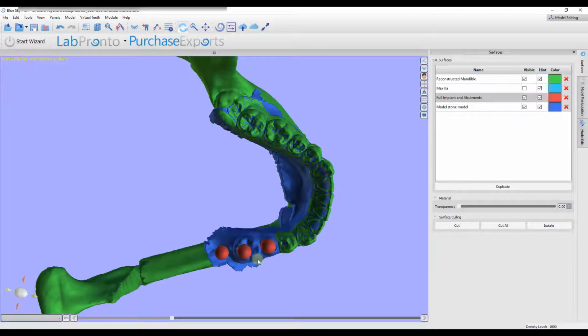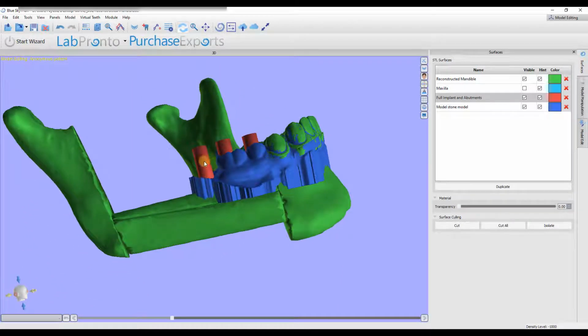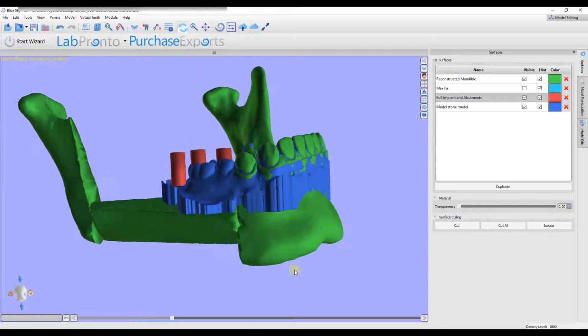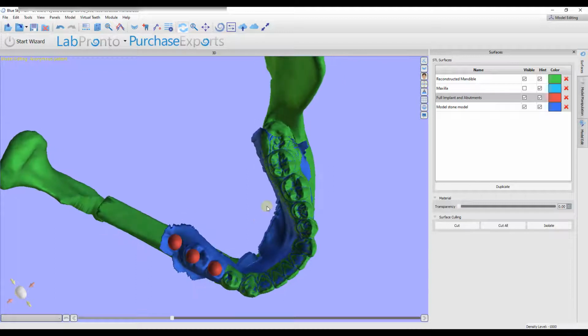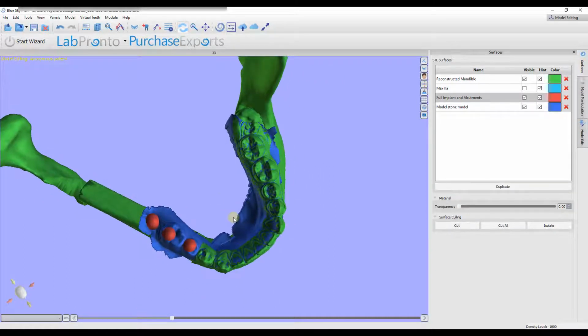And we're basically cloning these preoperative teeth to make the prosthesis. He had a molar extracted for a biopsy here, and we're going to add a molar back in there as well. And so the first thing I'm going to do is move this around, so I'm looking at it from the top. And I'm going to choose this dark blue model we just created. And then down here, I'm going to choose this cut tool.